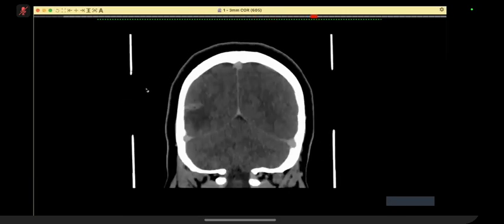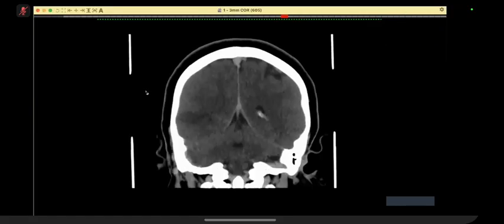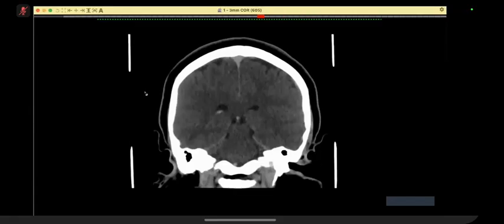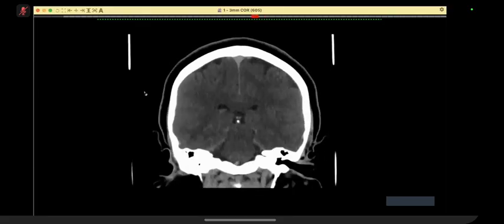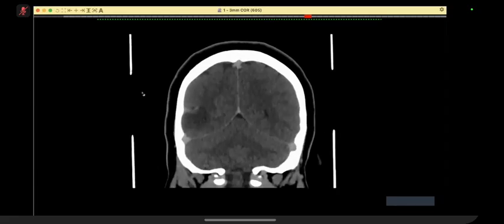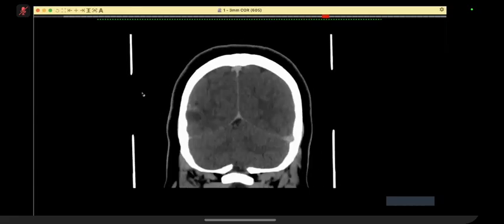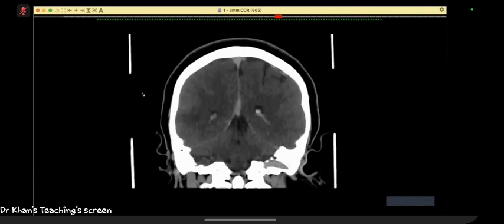So till now, what do you think is happening? In a patient where I'm suspecting gyriform kind of enhancement, I would like to inquire regarding history of any fever. No fever. Okay, because the differentials for this gyriform enhancement include encephalitis or some subacute infarct.